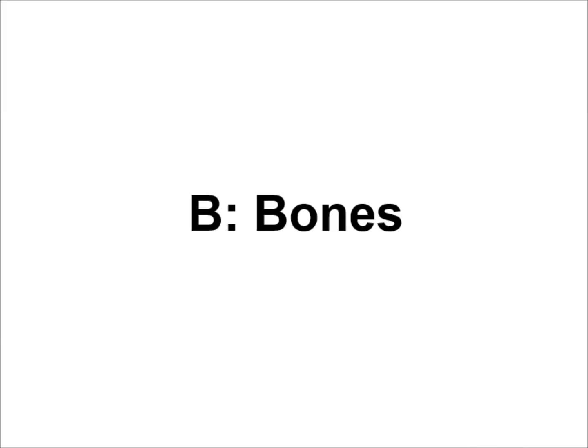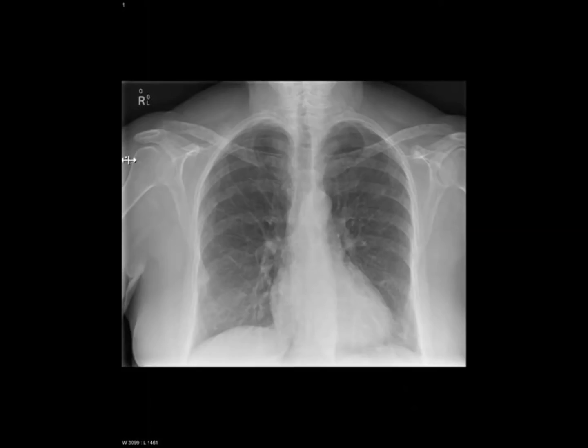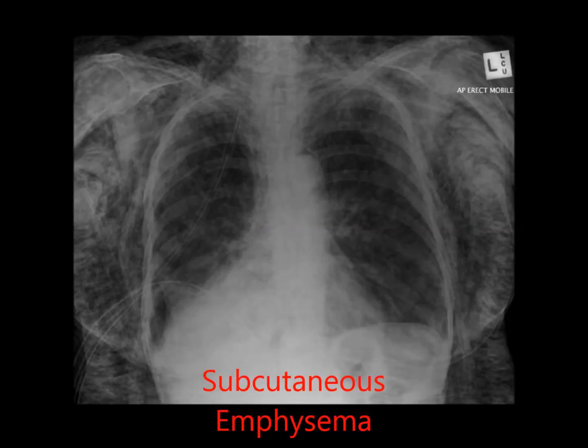The outlines of each bone should have a smooth contour, and a break in the contour could be a subtle indication of a fracture. Also look for any lesions where the bone is more or less dense than it should be, such as the punched out lesions often seen in multiple myeloma. Whilst looking at the bones, you should also look at the external soft tissue for any abnormalities.